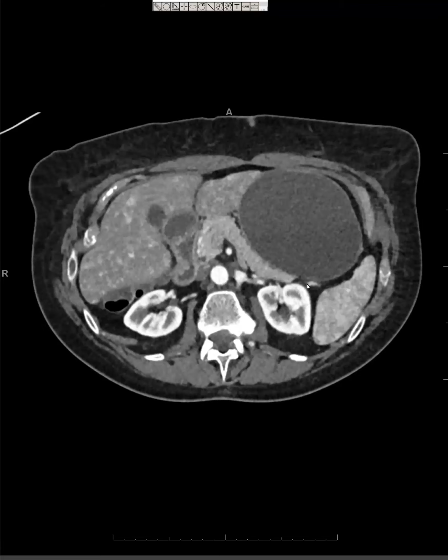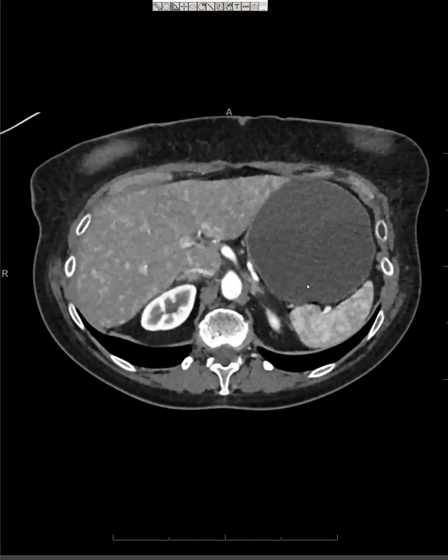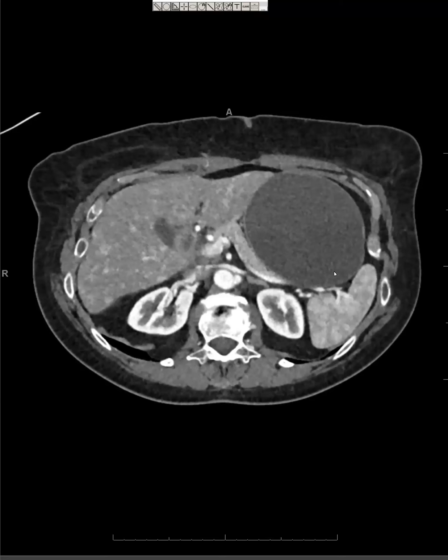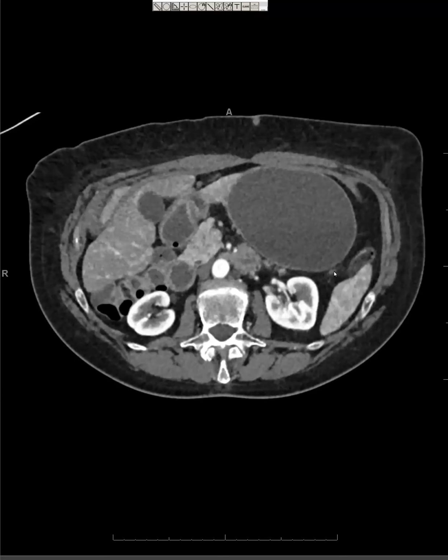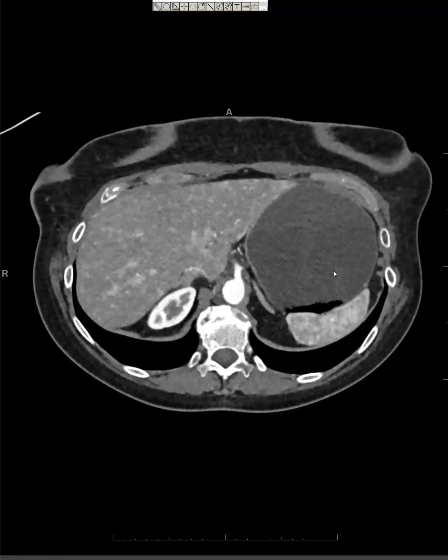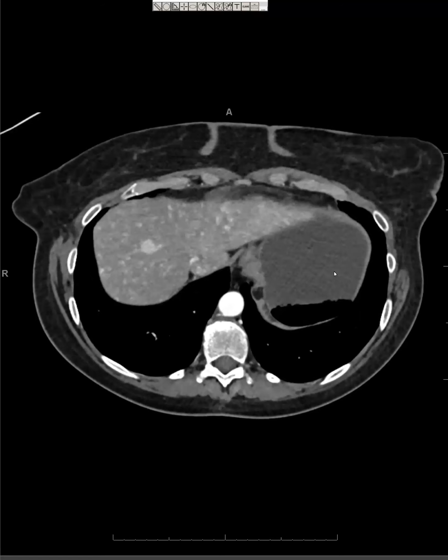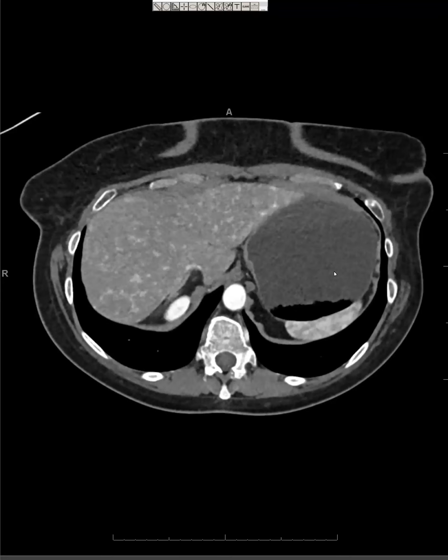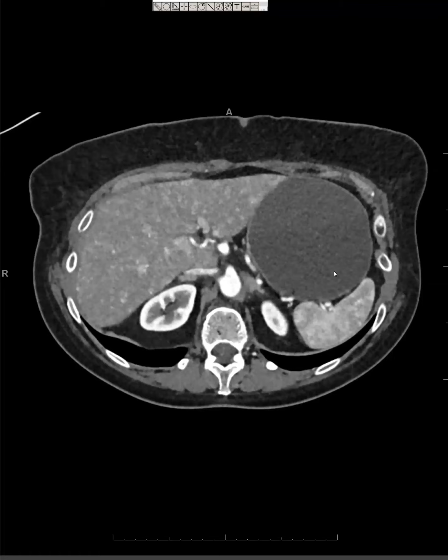What looks prominent? The hepatic artery. This one is not the most dramatic, but sometimes they get really big, hypertrophied, because they're feeding all those vascular shunts. They also get dysplasia, angiodysplasia, with HHT. So then I had a case where the segmental hepatic artery was very serpiginous looking and kind of abnormal.